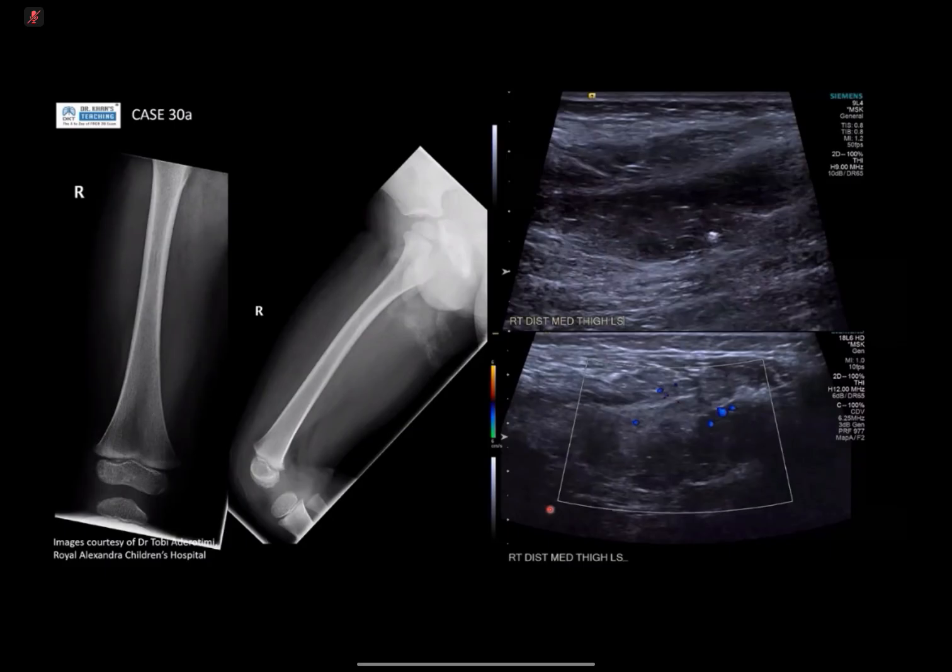It's kind of intermittent swelling in the region of the medial thigh, and then you look a bit closer, you wonder if there's some calcification within the soft tissues here. And then perhaps this could relate to this. If it's reducible, then it could be a... It's compressible as well. It's compressible on ultrasound. Okay, so this could be hemangioma again with the phlebolith.